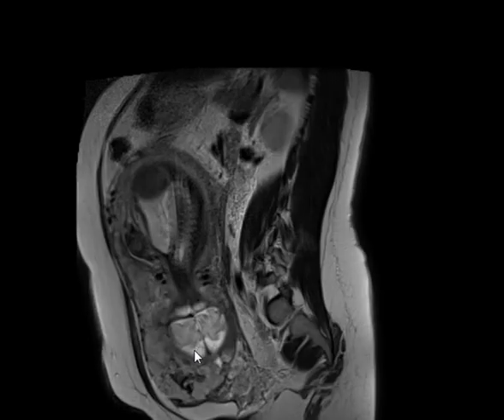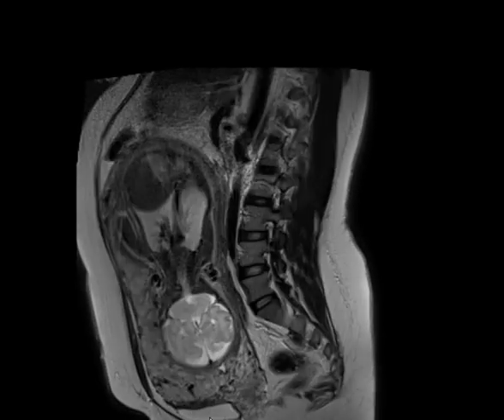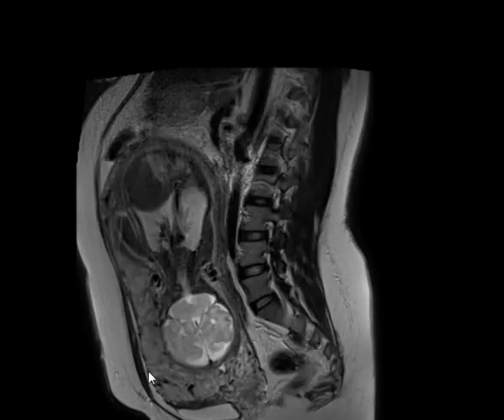The upper bladder wall shows irregularity, not smooth like the other sides. And the placenta is low lying, previa, covering the os. So with previa, we should suspect accreta. And the myometrium at the site of placental attachment is invaded by the placenta.